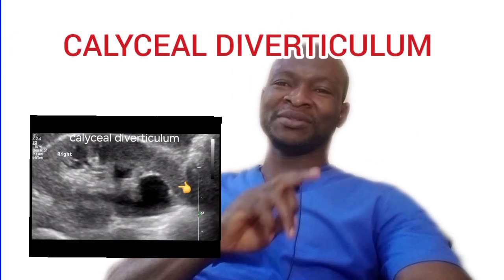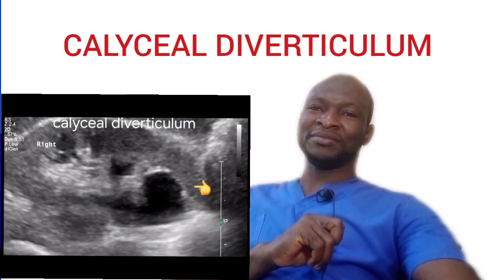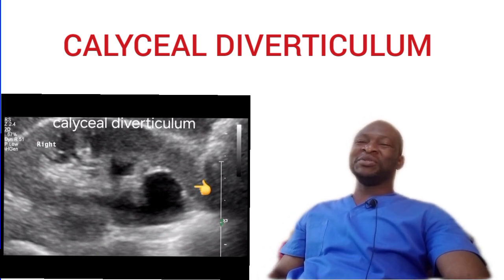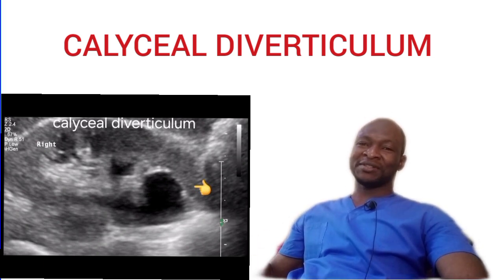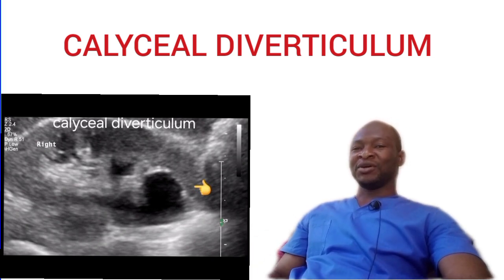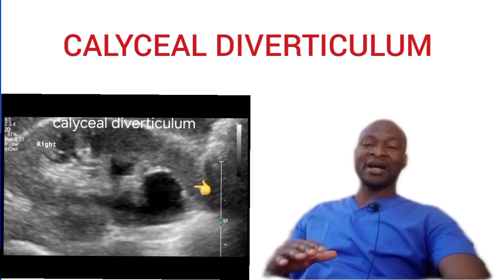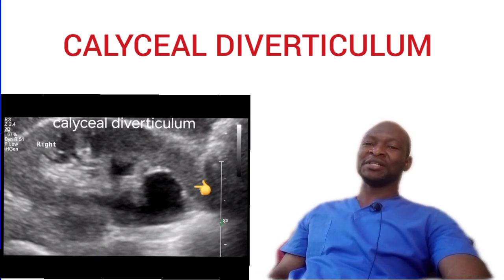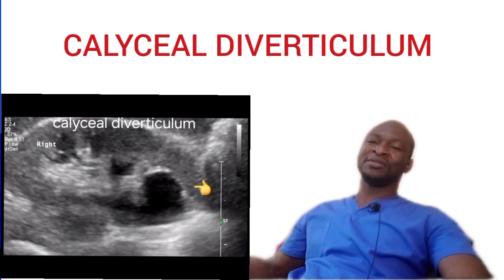Quickly, let's talk about calyceal diverticulum, or what you would call congenital megacalyces. Now, these are typically unilateral. They are non-obstructive cystic enlargement of the calyces. It is usually non-progressive. The renal parenchyma or cortical thickness and renal functions remain normal. Infection and stone formation increase because of this. Commonly it is associated with primary megaureter. On ultrasound, you'll be seeing a large clubbed calyx or calyceal cysts with normal cortical thickness.